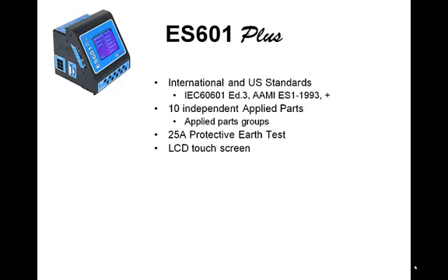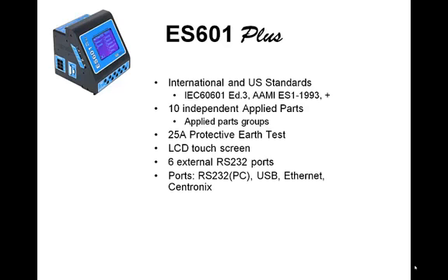It also has 6 external RS-232 ports to control other test equipment such as our Phase 3 defibrillator tester, an Impulse 4000, or even a SimCube. In addition, it has a port for RS-232 to PC communication, a USB device port, an Ethernet port, and a Centronics printer connector.